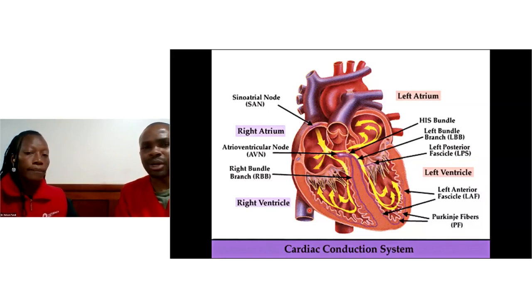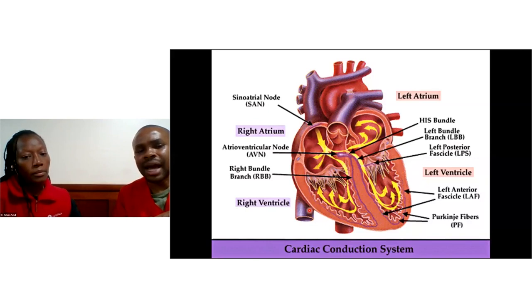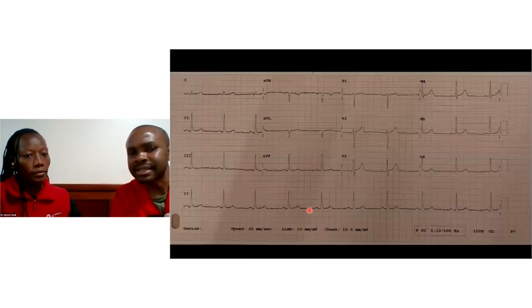All right, so what I'm understanding is, an ECG is a graphical representation of all that electrical activity in the heart. Very true. Maybe now I'll just ask Grace, if you don't mind, on this ECG, could you track for us how this current is flowing and just explain to us what are all these deflections and lines?